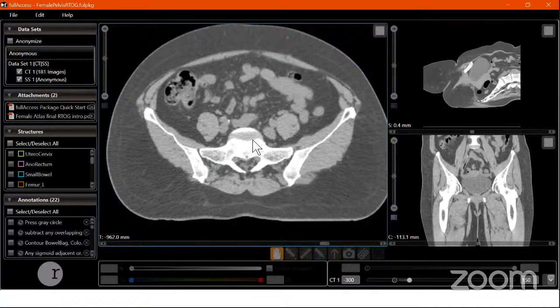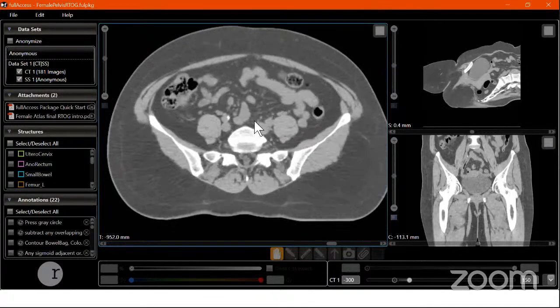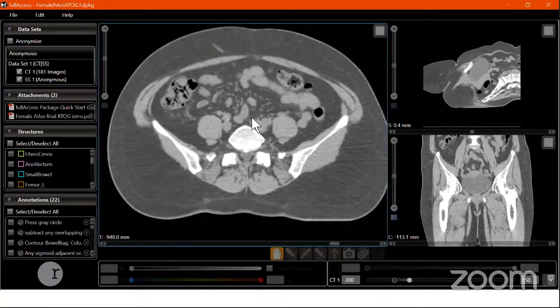This presacral group of nodes is commonly included in most contouring whenever the parametrium is involved. If the parametrium is not involved, we can try to avoid sacral nodal contours. So this is one addition to the standard 7 mm expansion of the aortic vessels and the iliac vessels.